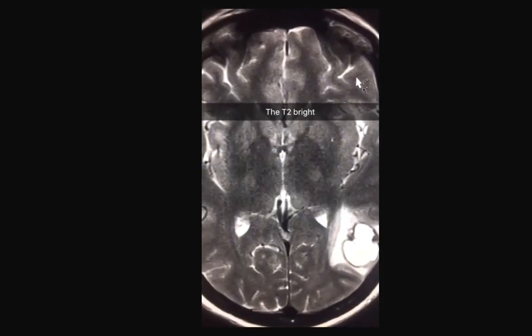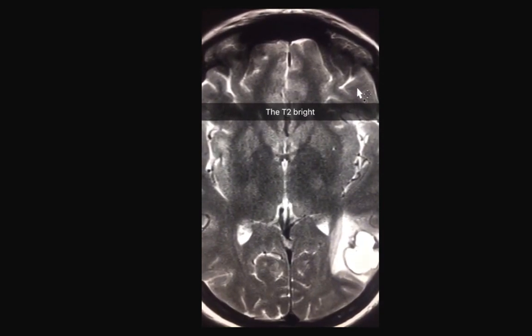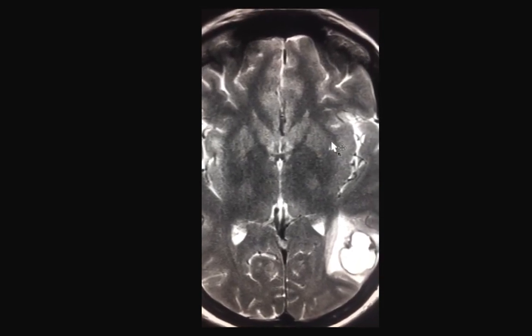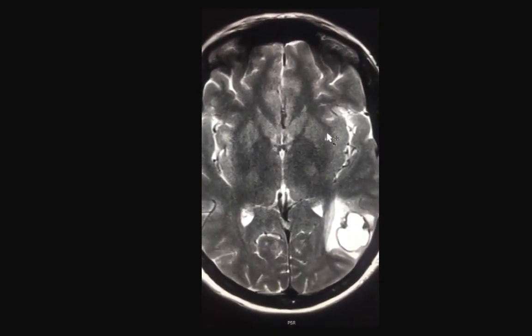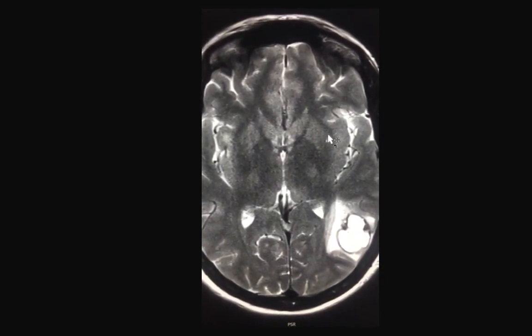Let's do the same with T2. On T2, bleeding is bright on the hyperacute and the late subacute phases only. So remember, whenever bleeding is bright on T2, there is no susceptibility artifacts. That means you would not have susceptibility artifact when the bleeding is in the hyperacute or late subacute stages. Let's go over this again.